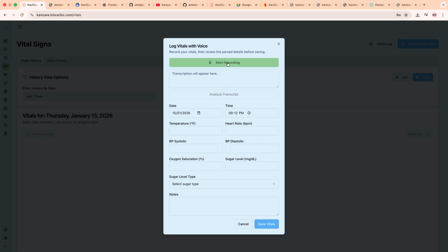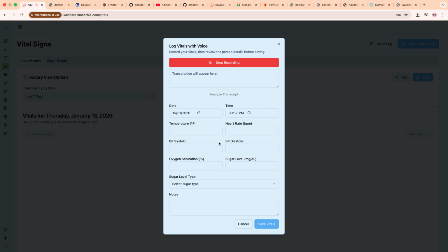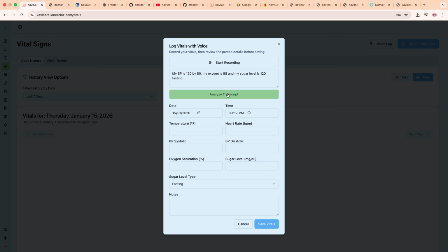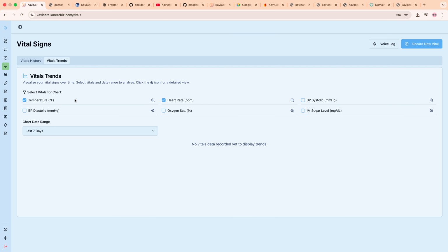For example, I can say, my BP is 120 by 80, my oxygen is 98, and my sugar level is 120 fasting. So it will come here and update everything. You can analyze the script and it will populate this, and you can save it. We'll not save it now. I'll do the bulk upload of the data to show the other flows. Here you can see the trends of each of the vitals that you have uploaded.